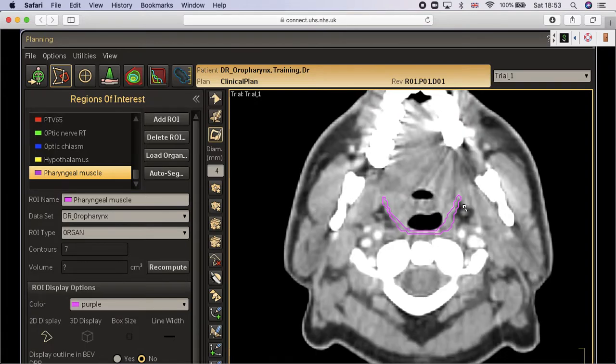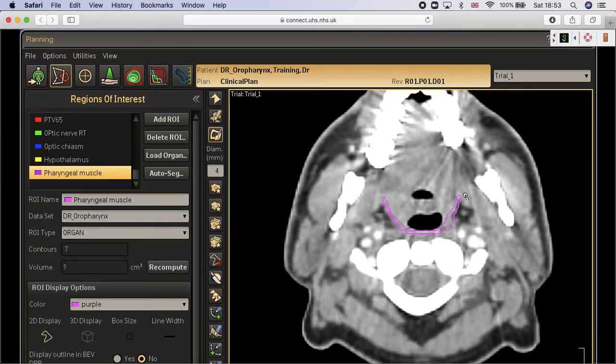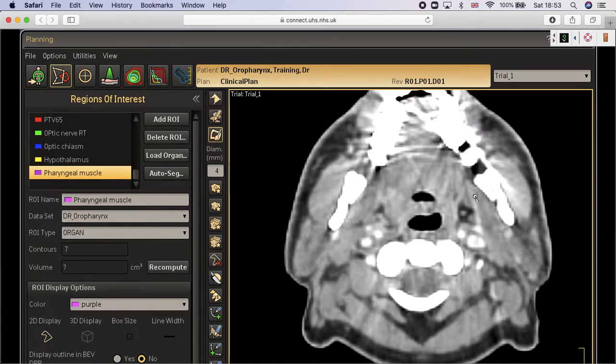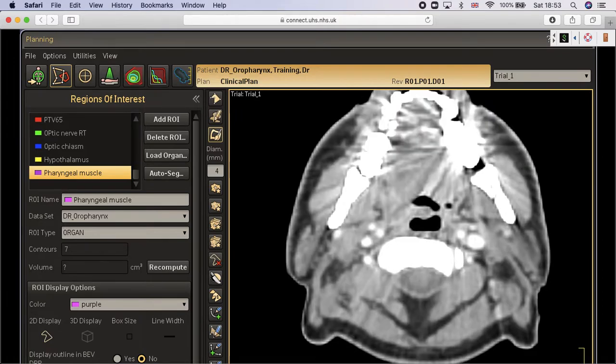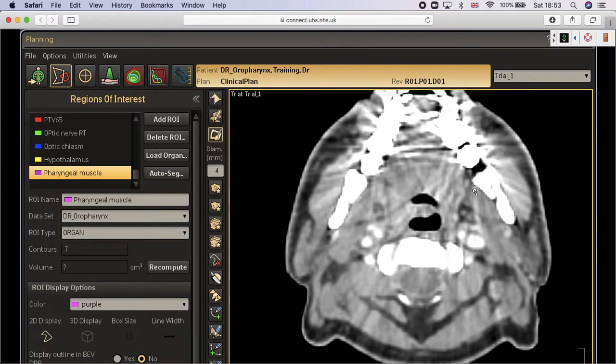You will see that the superior pharyngeal muscles, some of the guidelines will do it like that, and I want you just to share it with you. So some of the guidelines will do it something like that. So you join to the pharyngeal muscle up to the anterior mandible, and the reason is, and this is a very important trick in oropharynx, we will do it when we come to the oropharynx and the retropharyngeal extension. We'll tell you this trick.